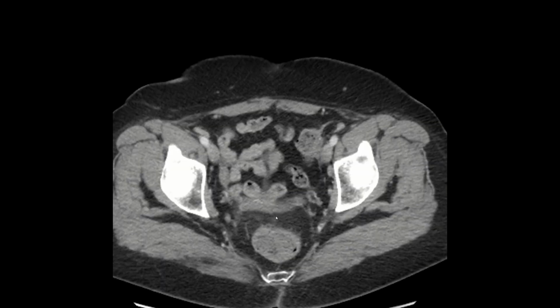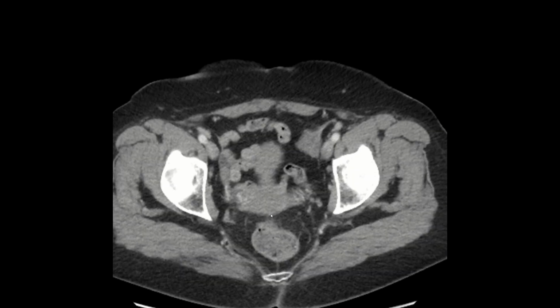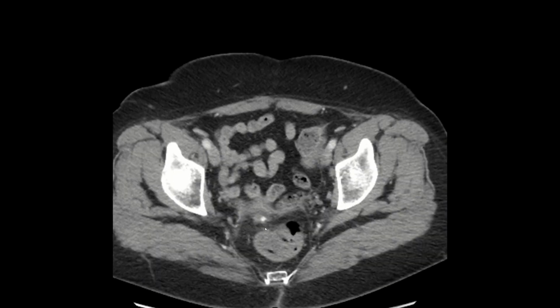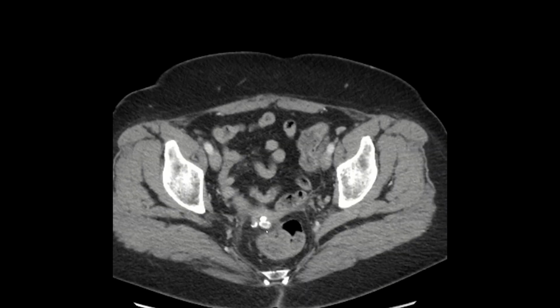So this space right here between the uterus and the rectum, the recto-uterine pouch of Douglas, it is the most dependent portion in the pelvis, and whenever something drops inside the intraperitoneal compartment, it will come to this location and stay there sometimes forever, such as appendectomy clips, dropped gallstones, or dropped appendicoliths like in this patient.